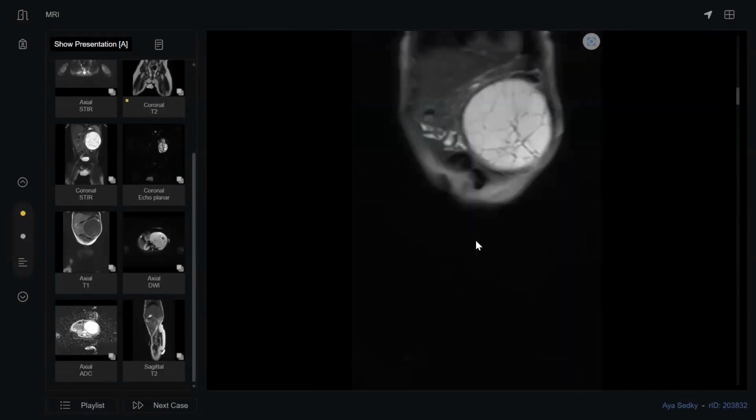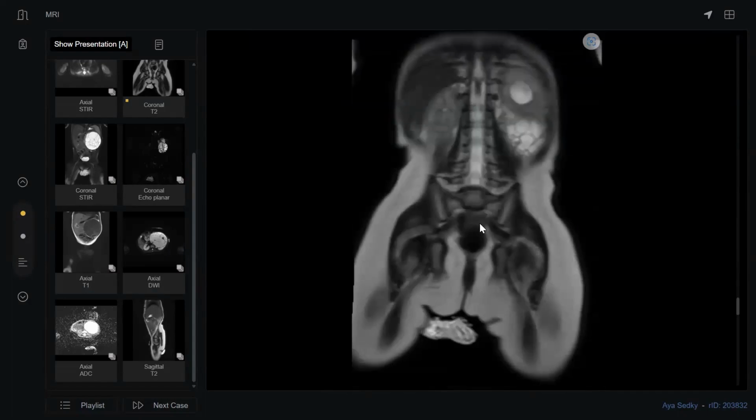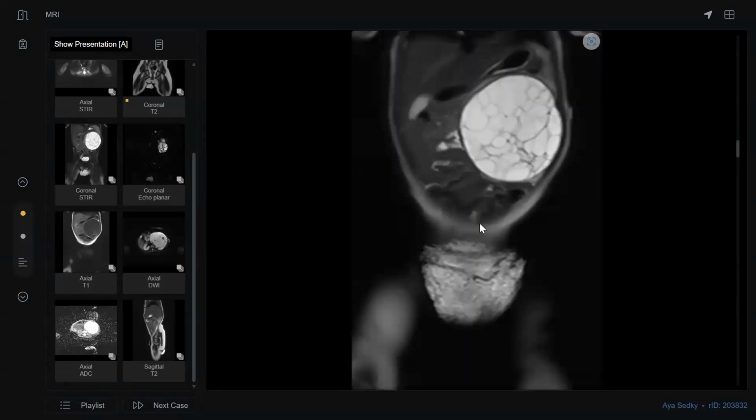This is a completely multicystic lesion, causing some hydronephrosis. When you tell the examiner about the differential, tell him the most common tumor in pediatrics, like Wilms tumor, but the cystic form of Wilms tumor. Okay, multicystic dysplastic kidney.